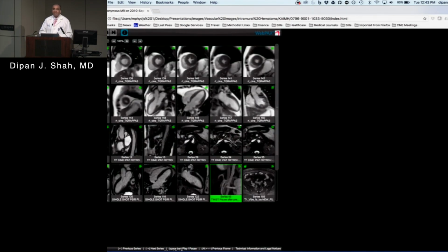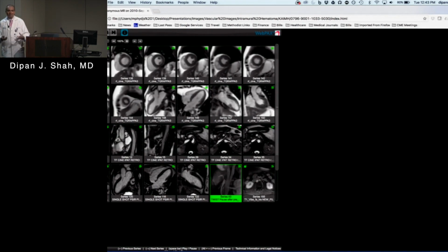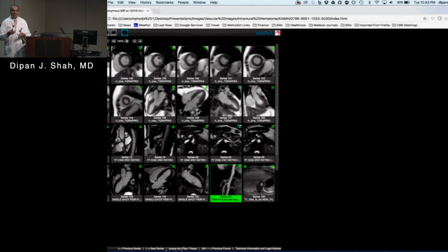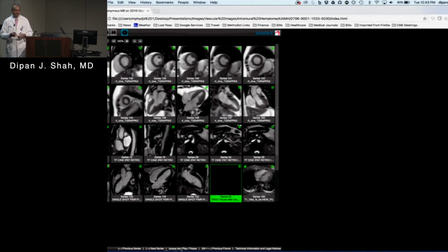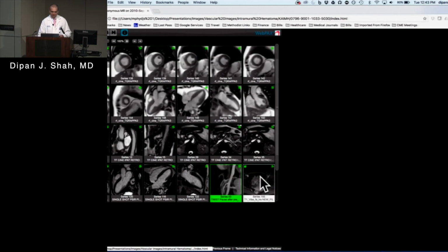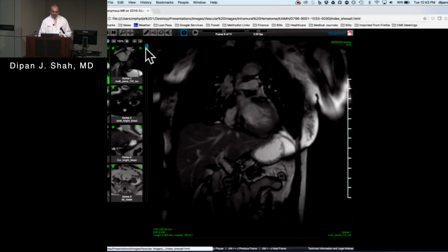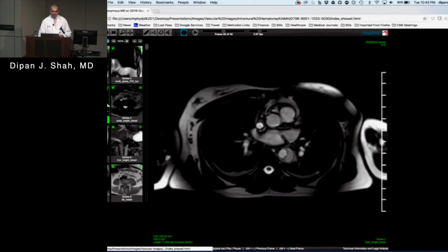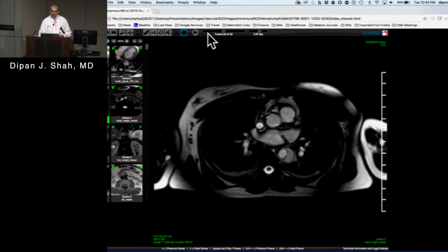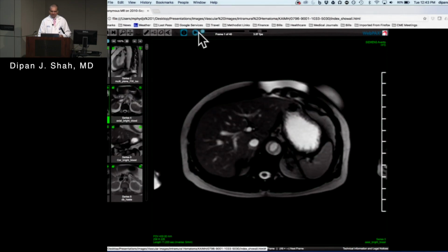No, because remember, you never want to look at just an angiogram, right? Maximum intensity projection. You want to actually look at raw images, that are thin slices to look for dissection. So I showed you that one first, but let's go through now and look at other images. Because again, the key for this is not just to look at one image, but look at a series of images. So let's start out with just these initial set of axial images that we acquire, again, using that bright blood technique.